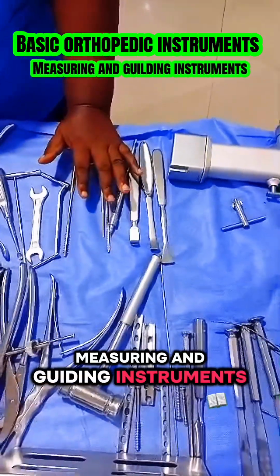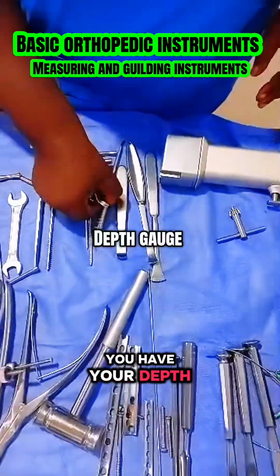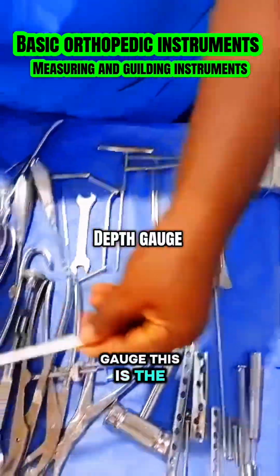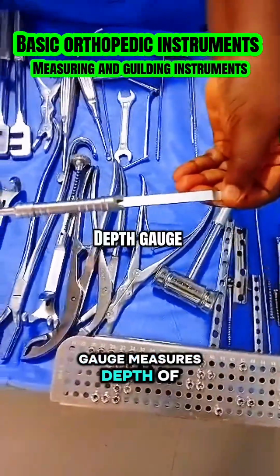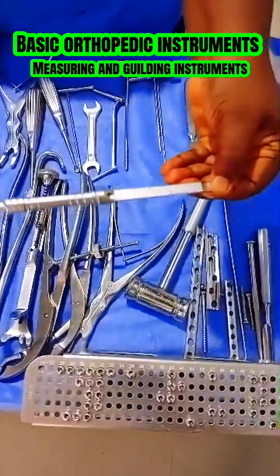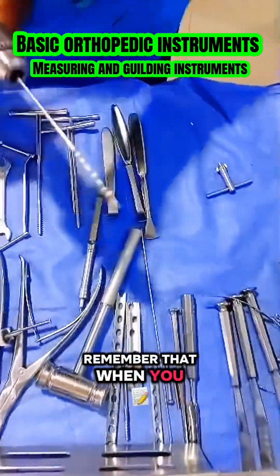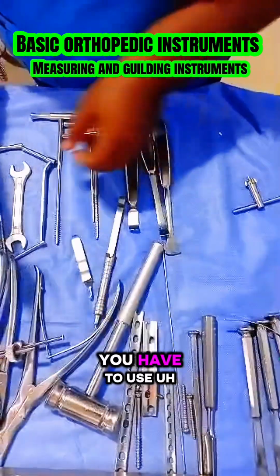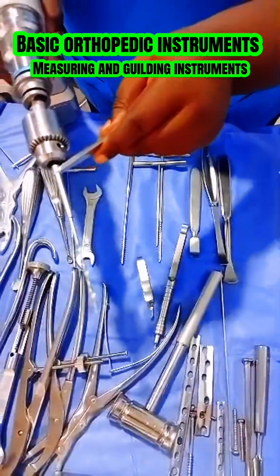Measuring and guiding instruments. This ensures correct placement of implants. You have your depth gauge. This is the depth gauge. You understand? This depth gauge measures the depth of the drilled hole. So this is your drill. Remember that when you are using this drill, you have to use the drill guide.